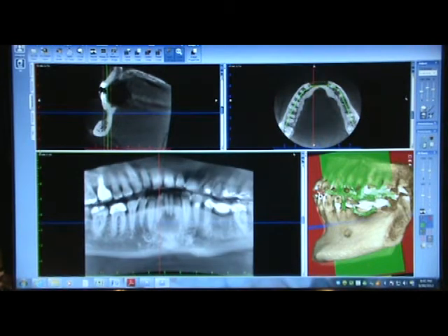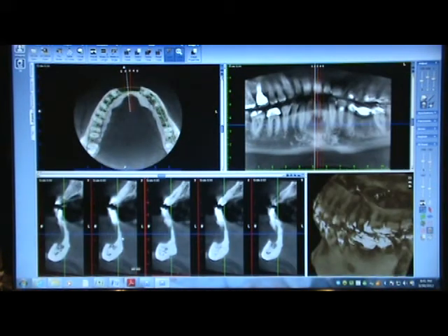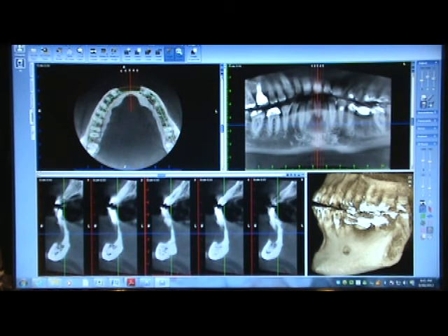Click the hand tool, and it will change. Remember, this pan section is the green line going around. Let's go over to the left, double click our implant tab. Here we go. Now, left click, that allows us to manipulate here. Now, we'll go to the top here, and there's an implant tab. We'll click that to bring down that drop down list.